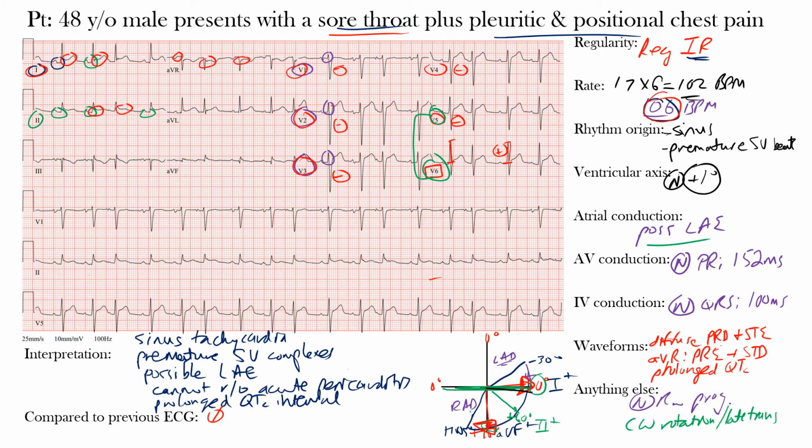Now, the typical EKG features that you see with acute pericarditis are static and slow changes that occur over days to weeks. So this is not like the MI where you have those dynamic fast changes occurring within hours. Okay, so the most common EKG features are generalized concave ST elevation, still less than 4 millimeters, with or without a J-point notch, and also PR depression. You'll also see reciprocal ST depression and PR elevation in aVR and sometimes in lead V1. And we saw that PR elevation and some of that ST depression here in lead aVR.